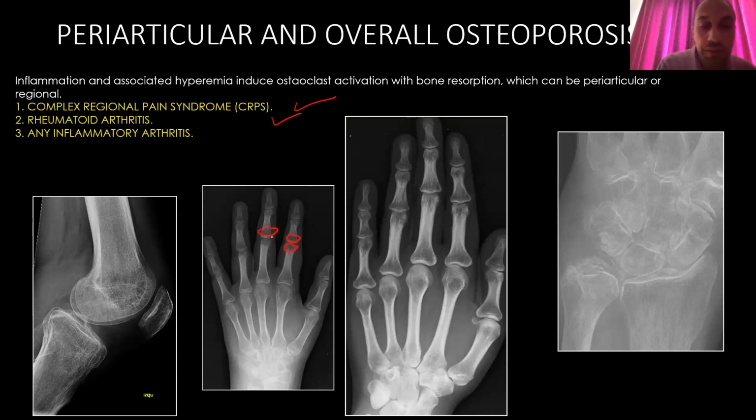You see this osteoporosis. When you say osteoporosis, don't say it based only on an impression. Osteoporosis means that this is the cortex and the endosteum, and this is the cortex and the endosteum, with the medulla between. When you add this and this together, it should be more than half of the bone width. But when you see here, adding here and here, it is a very thin cortex. So this is the osteoporosis. This is the meaning of osteoporosis. Okay?